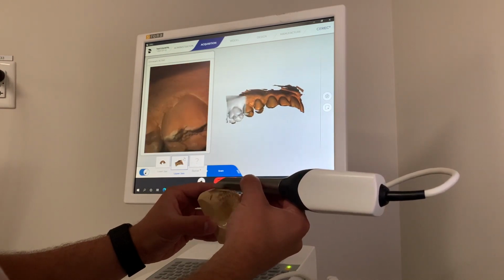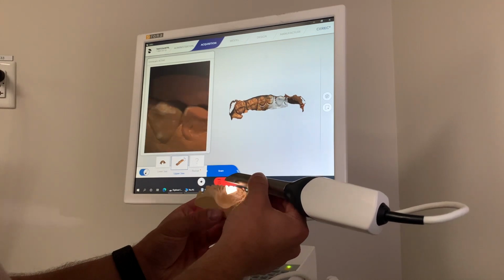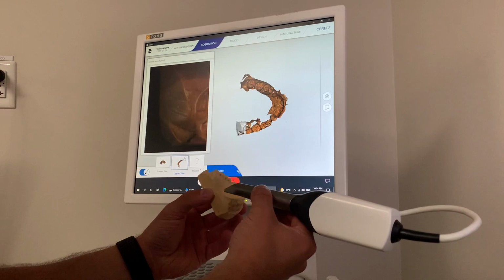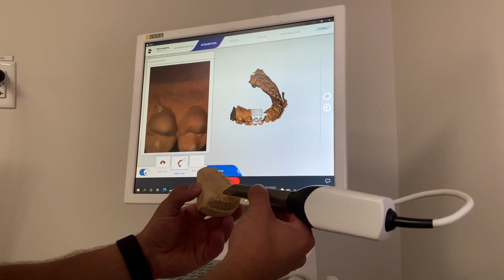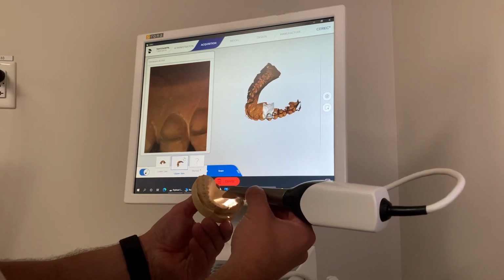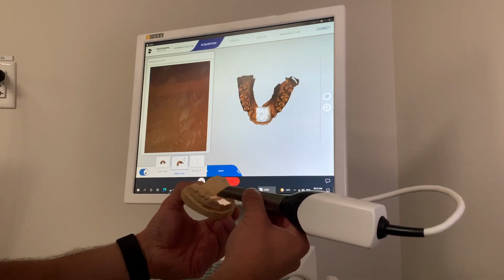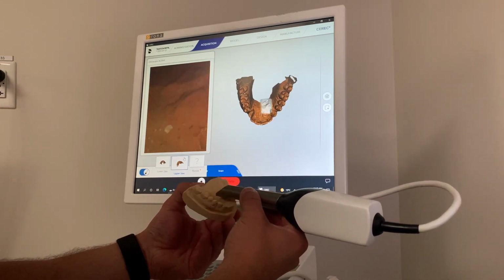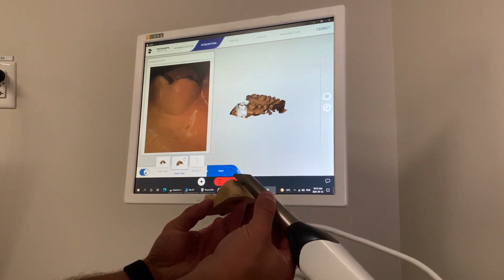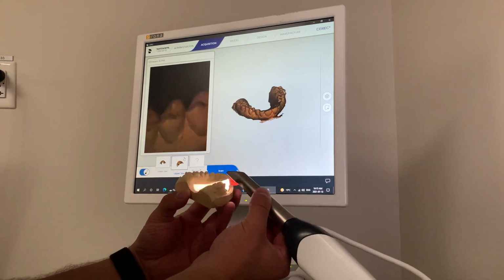That is mid-facial of one quad, and then the occlusal surfaces of all the teeth to the contralateral quad, and then we do the lingual of that quad to the contralateral quad, and then we go and scan the facial surfaces of the quad that we did not scan. For the maxillary cast, we want to make sure to get the rugae, and again, that is especially important in edentulous patients, as there is not a lot of information to go off of, and these scans need to have as much information as we can to identify the patients if we need that.